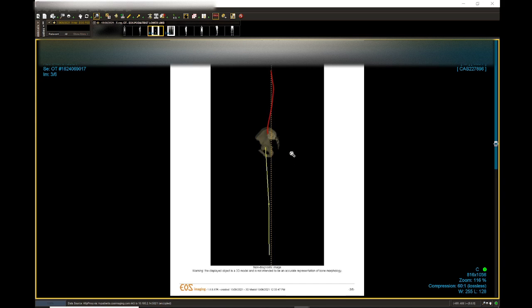And normally what I do is I get these pictures and measurements and I forward them on to the physio, the osteo, or the chiro, anyone that's treating the patient, for them to have a view of what's happening to the actual patient. All right, but it's good information to have, because it's tying the mechanics of the body together. And yes, sometimes it is related to the position of the actual legs.